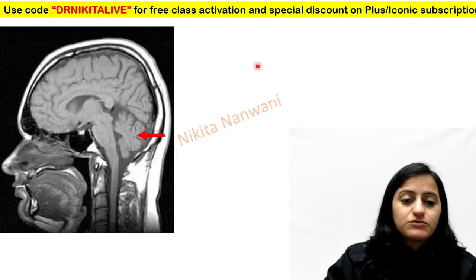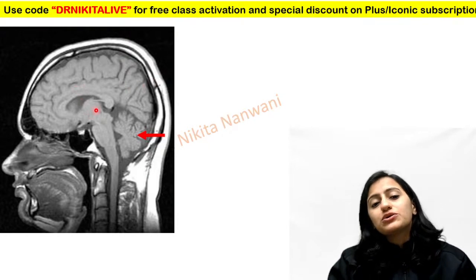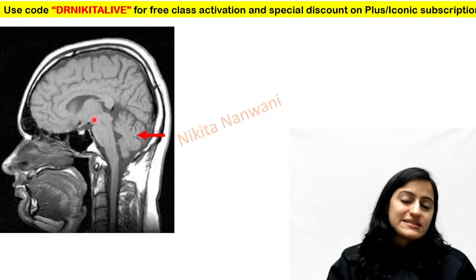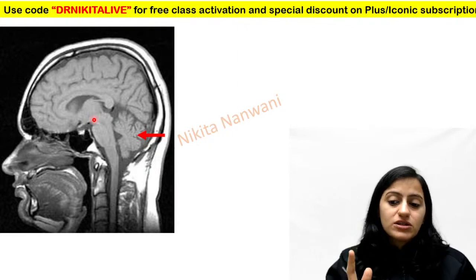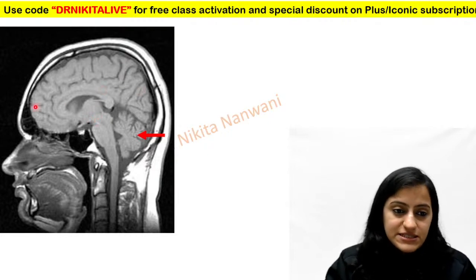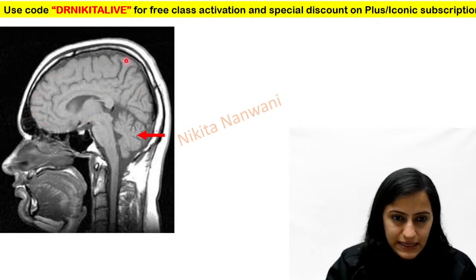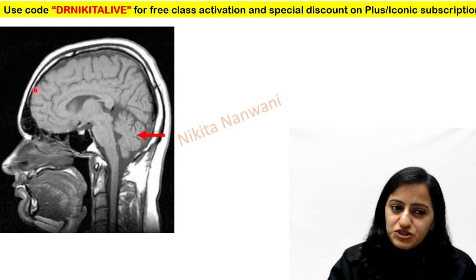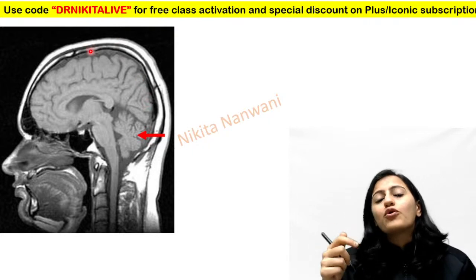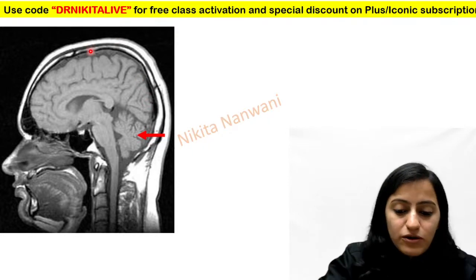Whenever you are confused, the trick here is you need to look for the bone cortex always, to see whether this is CT or MR. It's the bone cortex, not the bone marrow, remember that. And what we see here, just outside this brain parenchyma, I hope you all can appreciate this thin black line outside the brain parenchyma. That is the bone cortex, the inner table of the skull.